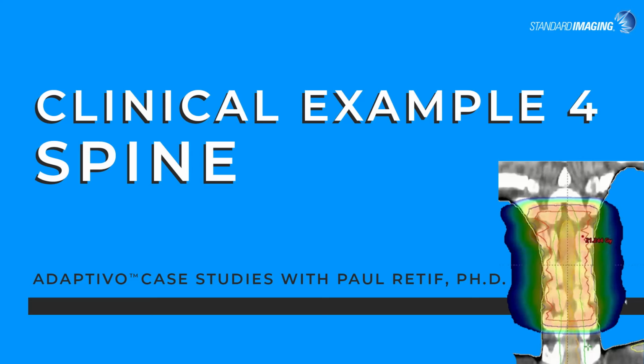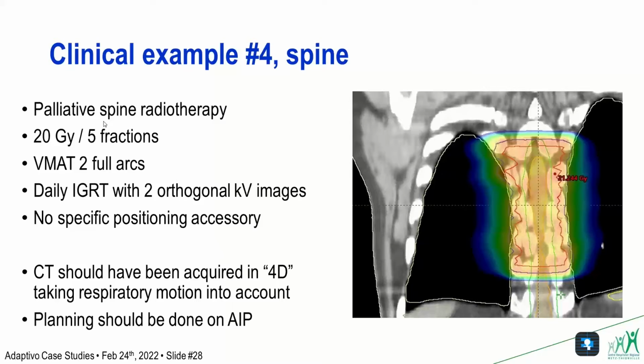The last clinical example of today is a palliative spine treatment of 20 grays, 5 fractions, VMAT, daily IGRT with 2 kV images, and no specific positioning accessory.